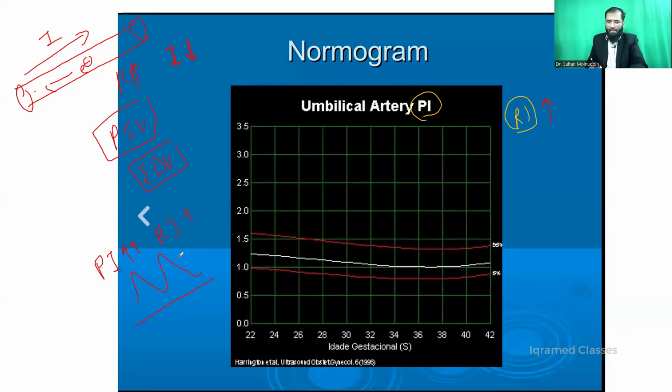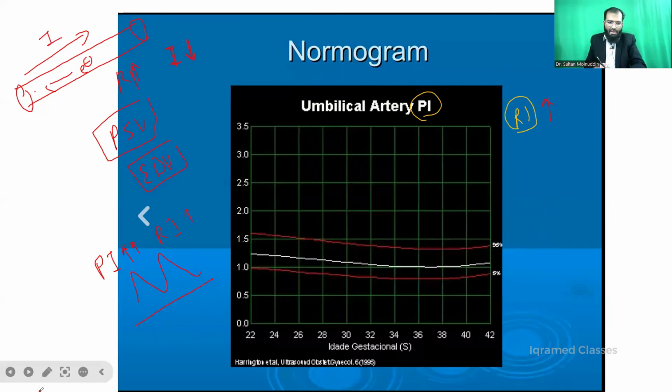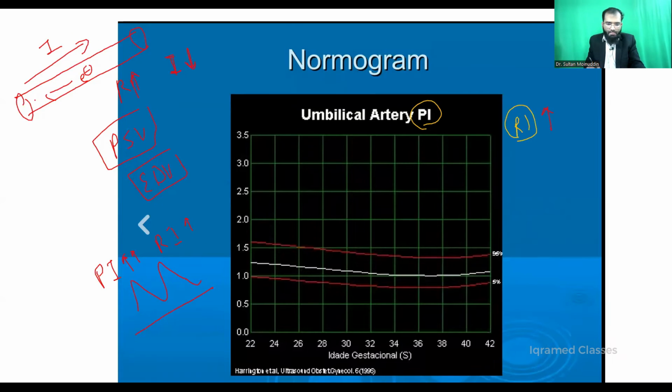Okay, now let's go ahead with this. So we have seen in brief about umbilical artery waveforms. Before we come to these umbilical artery waveforms, what I want you all to see is a few videos.